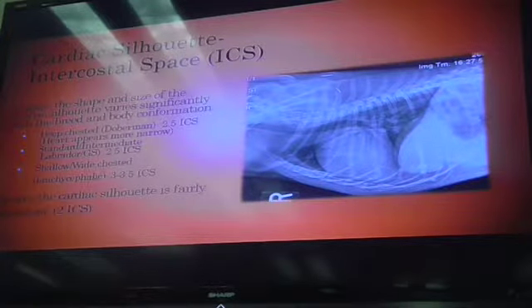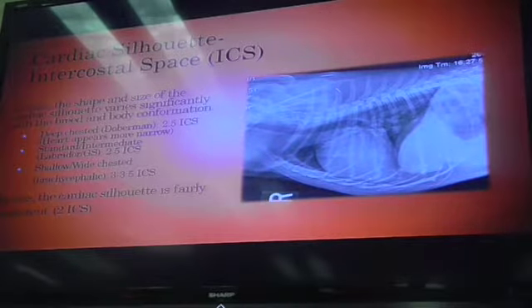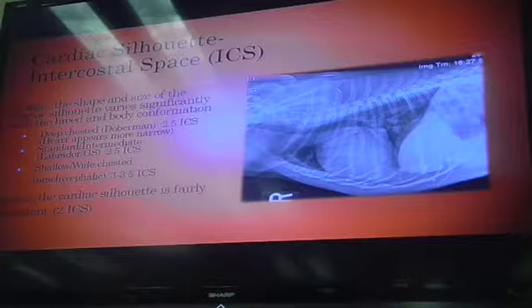All right. So on a plain radiograph, we're just really looking at that silhouette, right? So we're looking at this outline. We're looking at a soft tissue opacity. That's also a fluid opacity, because remember, soft tissue and fluid are going to be the same density, same opacity, so they're going to look the same. All right? So when we're looking at this, we want to quickly assess whether or not this is something that we need to spend more time looking into.